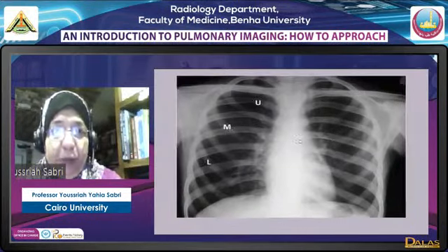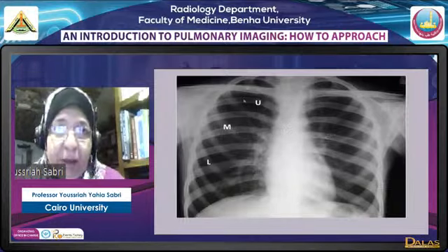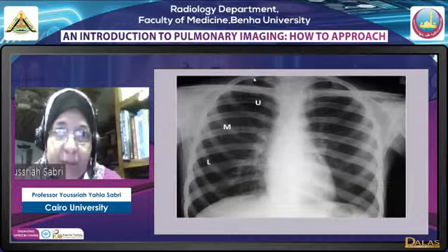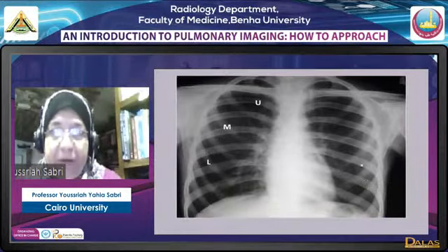الchest X-ray PA view ده عندنا ممكن أوصف الليجن zonal wise, which is an easy way. ده الأبر ده الفيرست ريب anterior part بتاعه. أول 2 ribs ده upper zone, من 2 ل 4 ribs anterior, this is the middle zone. Below the 4th rib anterior, this is the lower zone. على الرايت وعلى الليفت نفس الكلام.